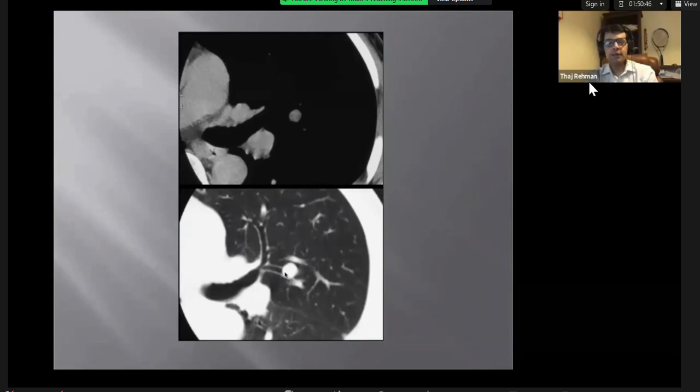This is an endobronchial abnormality. So when you see a nodule on CT, try to look at the bronchus, and if it's an endobronchial nodule, try to make the diagnosis straight away without the examiner giving prompts. So the next step would be a bronchoscopy and biopsy, and the differentials in this case, because it's central and endobronchial, carcinoid. Second differential would be?